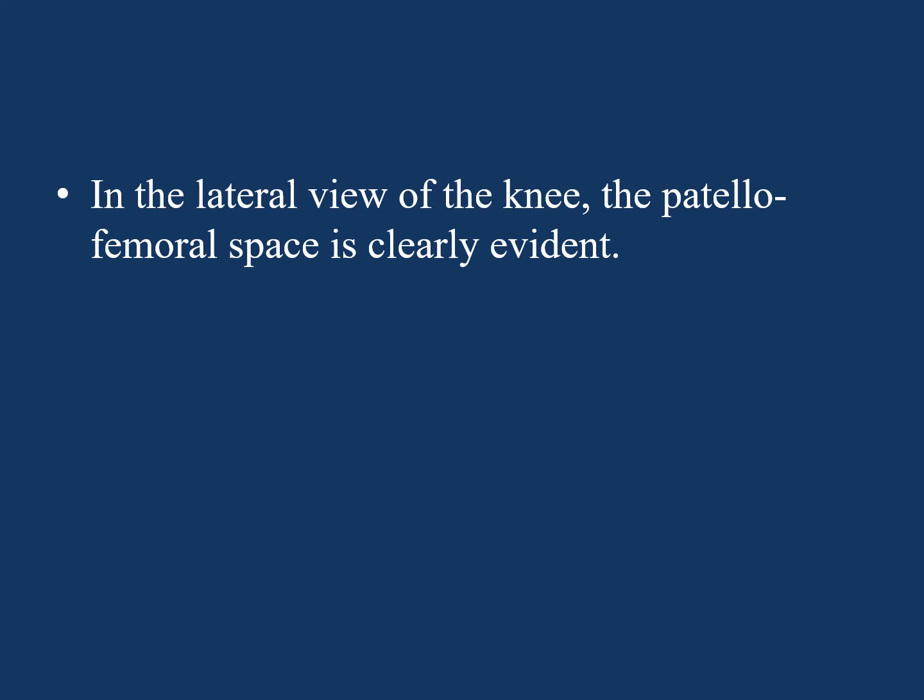And how does it look? Here, we see the patella very clearly. Again, in the lateral view of the knee, the patella or the patellofemoral space is clearly evident.